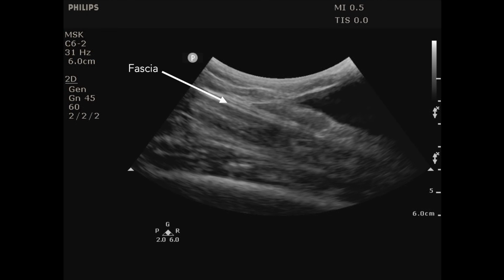And if we go back to that other image where you can see the fascia, you can really point out your anatomical features of where these things are at. So hopefully that was helpful. I know this is a little bit shorter, which is probably a good thing.